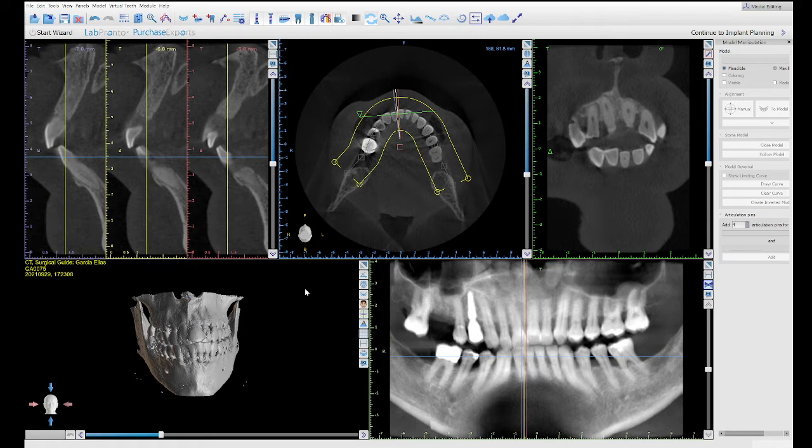So I'm going to go ahead and click that and see, it opens this window here, so you can see the actual file that I'm going to be importing. I'm going to go ahead and click OK. And the beauty of this is most of the time it'll automatically stitch it together. That's why this window shows up. It is a maxilla. I'm going to click OK and see if the calculation is going to be done by itself.